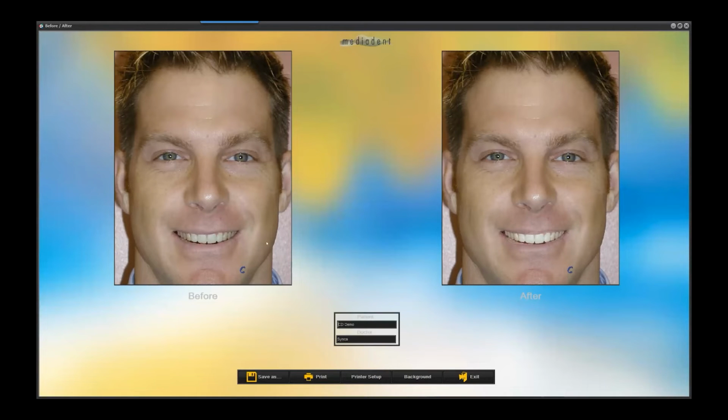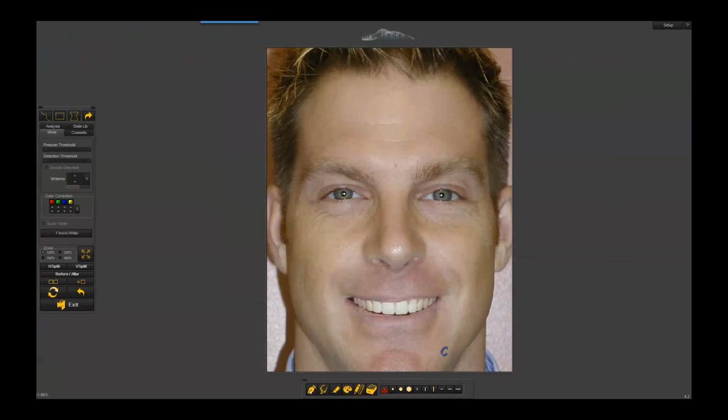If at this point I wanted to take this picture and save it in a thumbnail or under imaging in Open Dental, we can do that. We just can't go the other way yet. You would click on it and hit export. How is it bridged to that patient's chart, is my question.